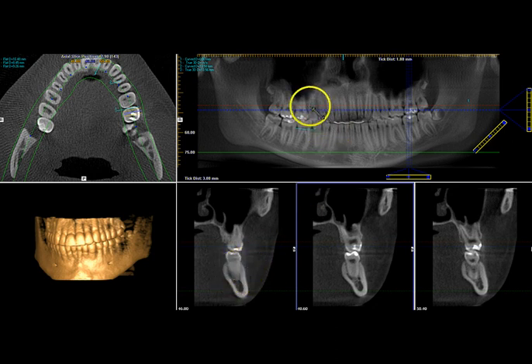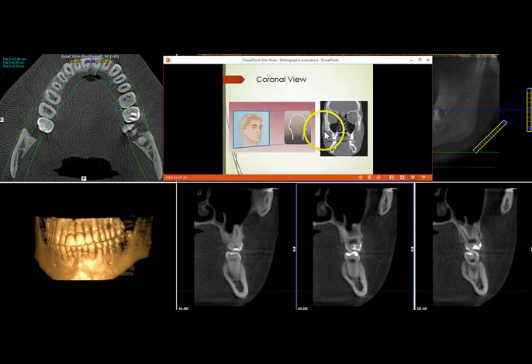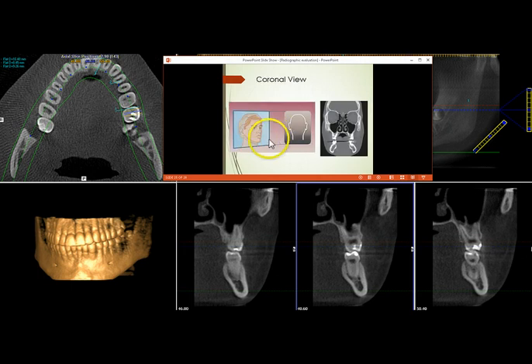It could be sagittal from canine to canine, but behind the canine it becomes almost the coronal. And if you remember the coronal, it's basically going from the front of the face to the back straight down. It's like you're peeking outside a window, and each layer that goes through the window is represented over here, and you can see the cross section here.